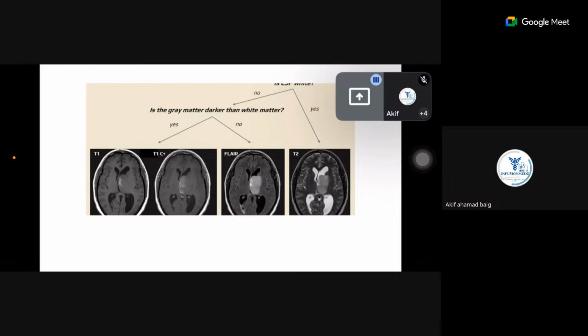But once we pass anatomy and physiology, our shades change. So the outer gray matter will become whiter and the white matter becomes gray in T2. It is the opposite of T1. And what is FLAIR? FLAIR is nothing but a blend of T2. That's why I placed T2 and FLAIR beside each other. If the water in T2, that is the white structure in T2, is suppressed, what is water in the brain? It is CSF. So if you suppress the CSF in T2, it is FLAIR.